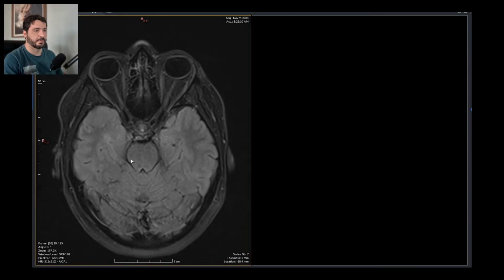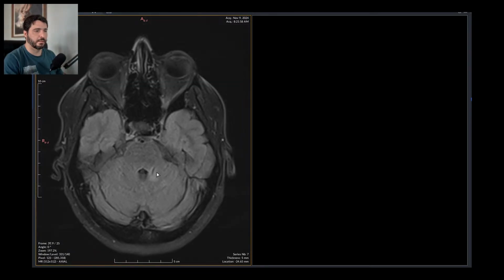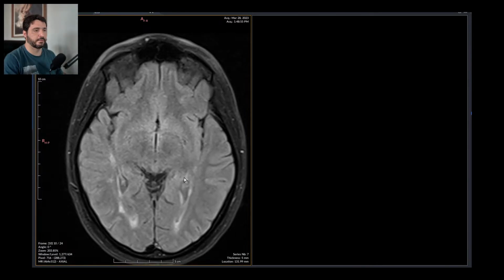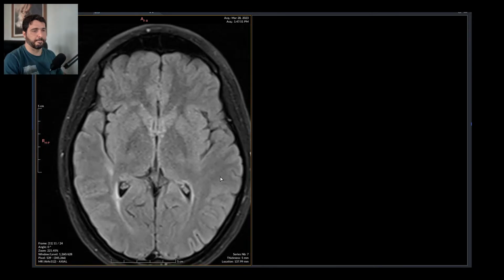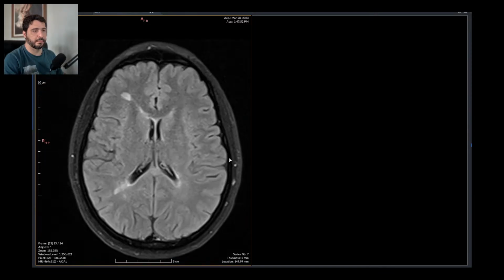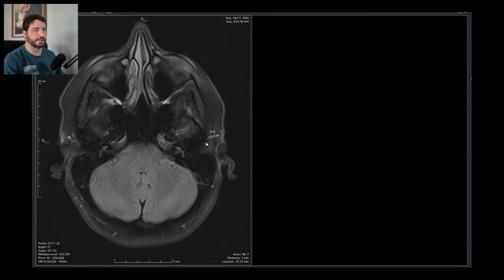I suppose there was something here, because on the volumetric you can see this and that, and it's really the same. It's not a proper follow-up scan, because there was no volumetric FLAIR, but as much as we can tell, the disease is pretty much the same. So let's grab a Fazekas 2 template.